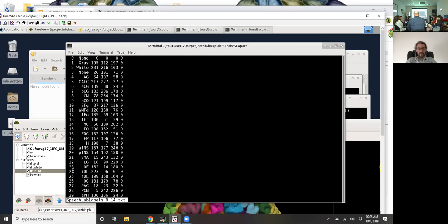It's redundant for our purposes, because if you look into the annotation file, in some of the literature, there is some case where you do want those numbers. But what really matters here is that you have, let's say, anterior insula, and you have this RGB value. This RGB value is essentially the value that's assigned to a vertex that is in anterior insula.